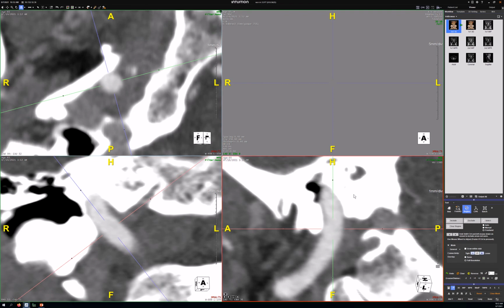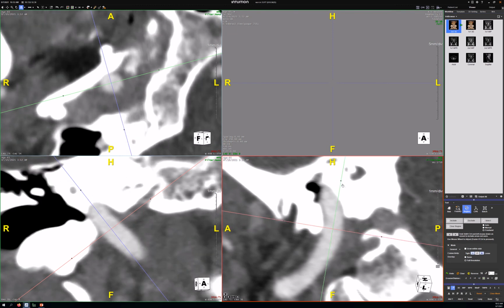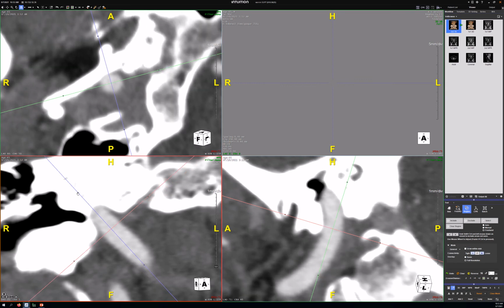And then here, rotate it clockwise about 4 degrees. A little more. Sorry, it's more than 4 degrees. Stop. Go back a little bit. So up here, you're very close to a circle. You need to fix this one a little bit too. Counterclockwise, 3 degrees. Stop. Okay.